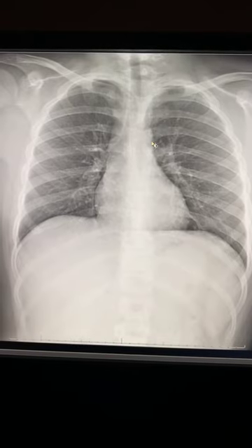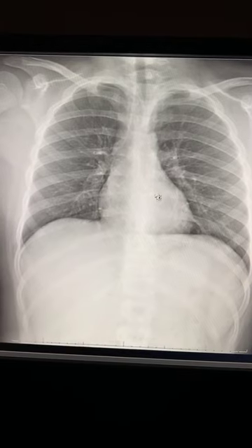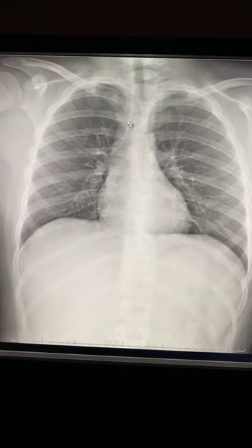I like to call it the notch. And you want to see this descending aorta. Look, another line. Again, I love lines on chest x-rays. So I see this nice sharp line right here. That's beautiful. Now I'm going back up and I see, what is this?